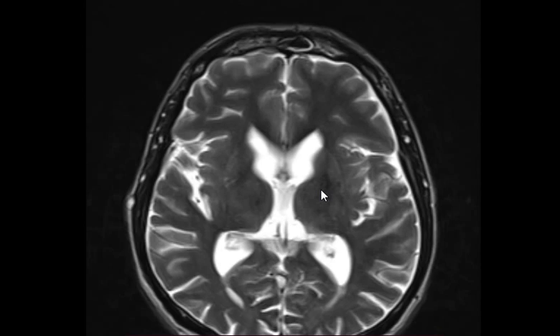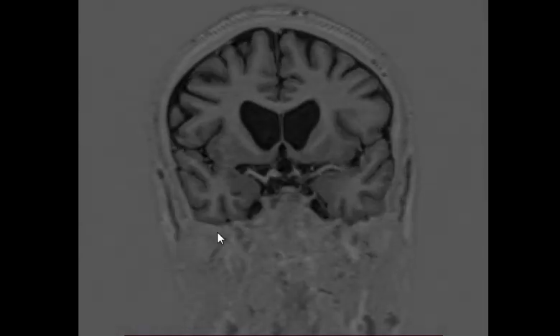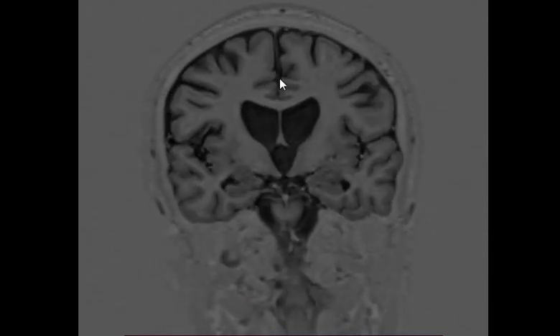What's the name of this lateral ventricle appearance? This is very nice to demonstrate the basal ganglia. You can see here, they're basically just this one, okay? So this ventricle shape is called box-shaped, exactly. This is a box-shaped lateral ventricle.